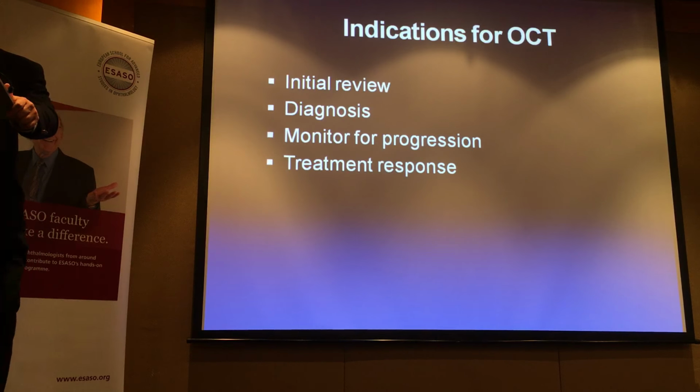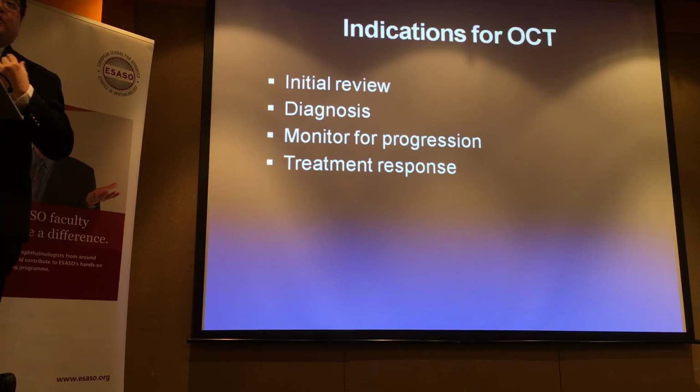Some patients with DME, for example, or AMD, have a lot of fluid, a lot of hemorrhage. We can see this clinically. Frankly, we don't need an OCT to tell us; our clinical skills are enough to pick it up. But how many times have we seen a patient where, clinically, you can't really tell, or maybe I'm just not that good, but on the OCT, you see some activity. Okay, so it changes our paradigm, but of course, that's also the question. Are we treating the OCT or are we treating the patient? Right? The days when we treated clinically significant macular edema was just that, clinical examination, compared to now we're treating basically center involving DME. Quite different things.